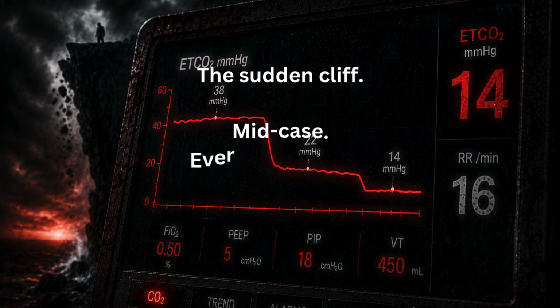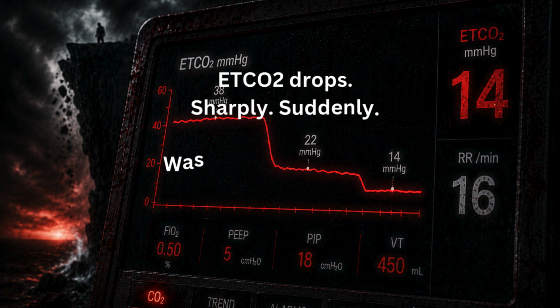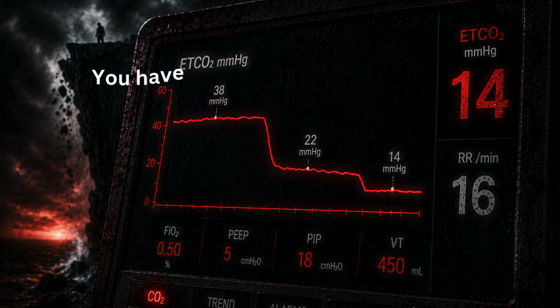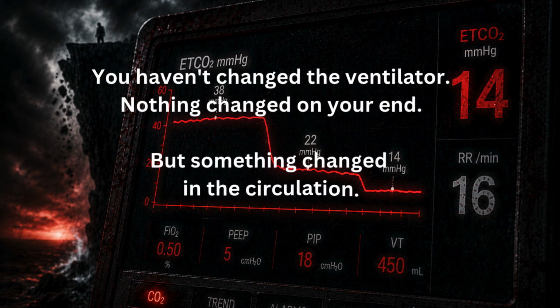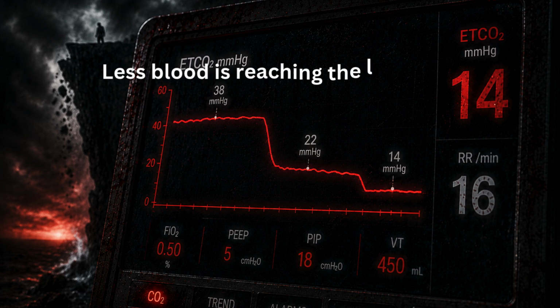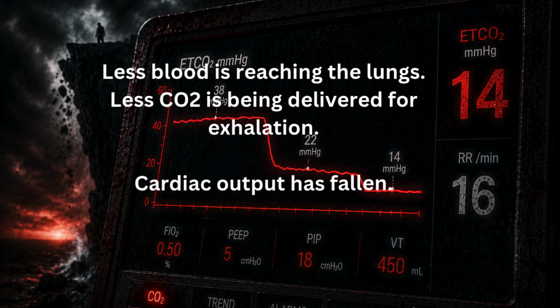The sudden cliff, mid-case, everything stable. Then ETCO₂ drops, sharply, suddenly. Was 38, now 22, now 14. You haven't changed the ventilator. Nothing changed on your end, but something changed in the circulation. Less blood is reaching the lungs. Less CO2 is being delivered for exhalation.